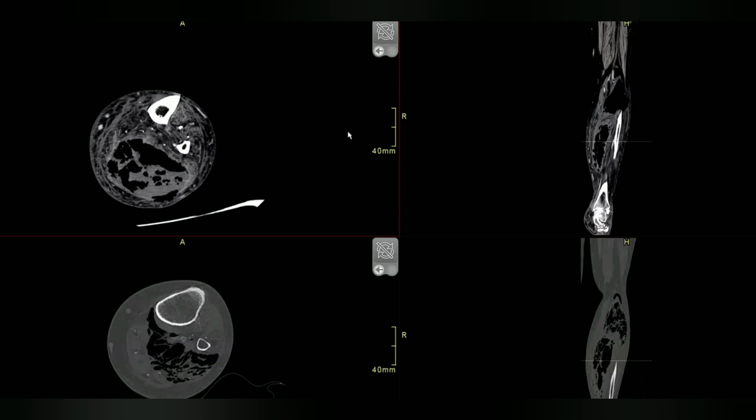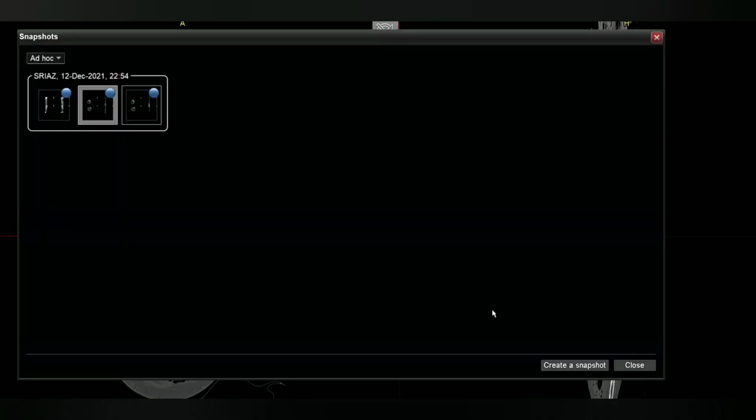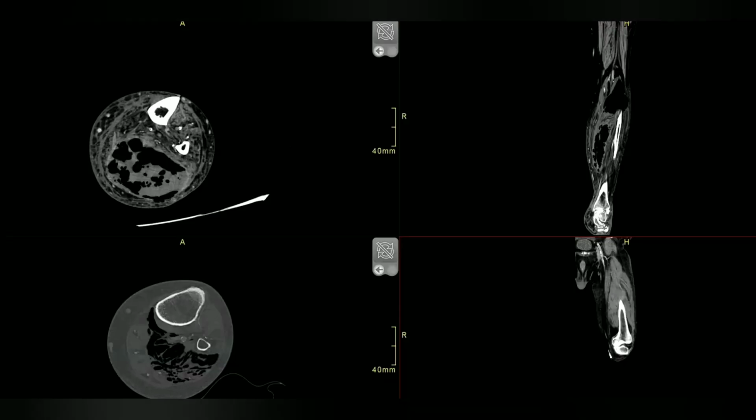So you can see the extensive subcutaneous emphysema in all the posterior compartment, basically. And then this is the post-op. So you can see that they did debridement, and now there's a little bit residual left, and it didn't extend up. So they controlled it. Otherwise, if it had extended, it could go into the abdomen, anywhere. So this was necrotizing myositis and necrotizing fasciitis.